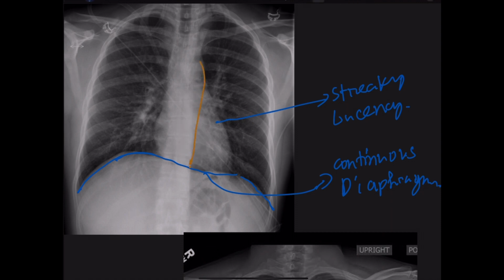You can clearly identify its course above the diaphragm, and this will give you a proper diagnosis of a typical pneumomediastinum.